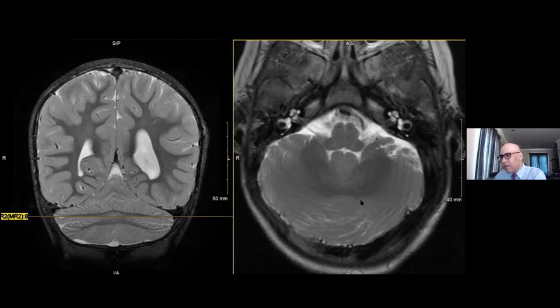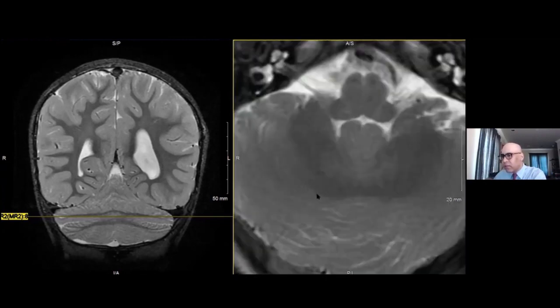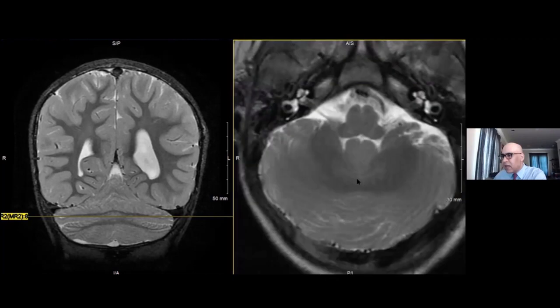But for the most part, we have midline continuity between the two cerebellar hemispheres, likely midline continuity or at least close apposition of the dentate nuclei in the deep cerebellar gray matter. So this is an entity called rhombencephalosynapsis. During development, the rhombencephalon is the hindbrain. And if we think synapsis comes together, so rhombencephalosynapsis means the rhombencephalon has come together. Or in this case, actually, it never cleaved, it stayed together.